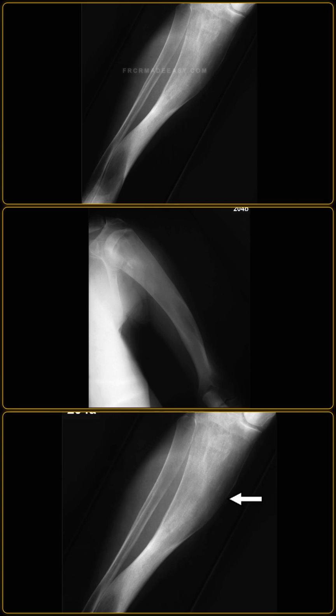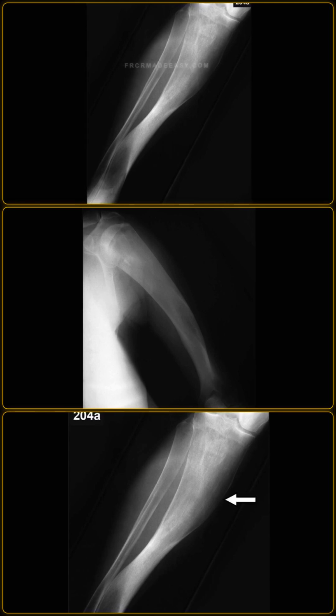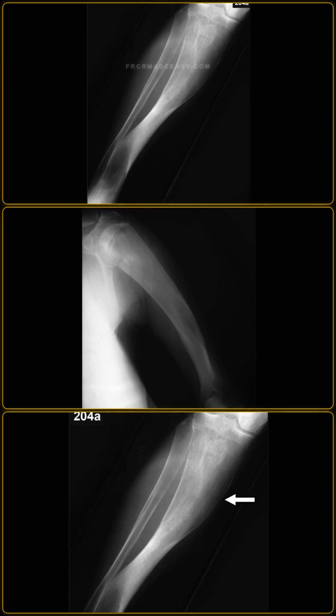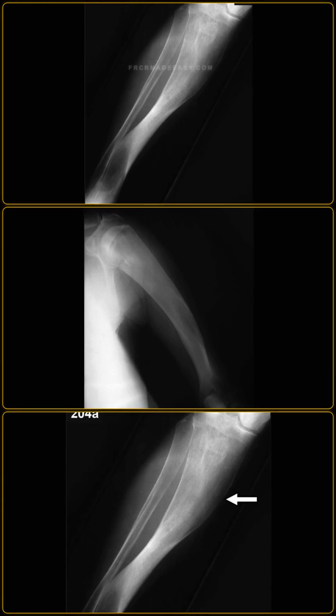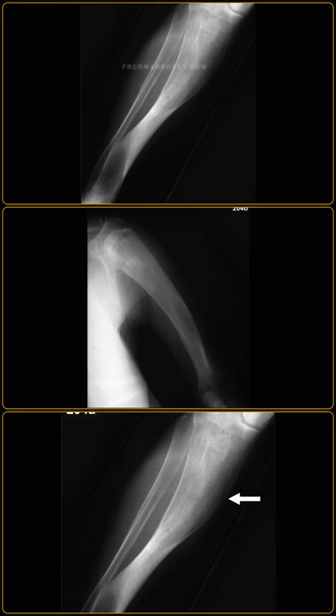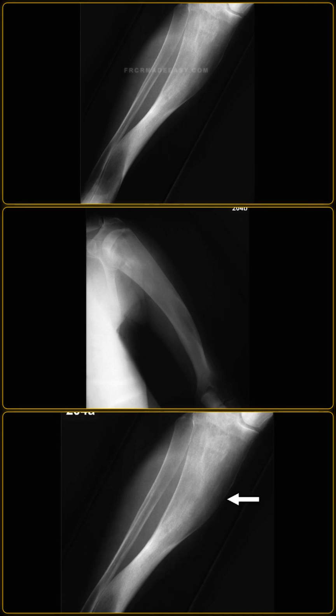How would you manage this patient as a radiologist? As a radiologist, I would document the extent of the skeletal dysplastic changes. Given the differential diagnosis, I would recommend a skull radiograph to confidently exclude craniometaphyseal dysplasia by checking for skull-base sclerosis. I would also suggest clinical correlation to ensure the patient does not have hepatosplenomegaly or cranial nerve palsies.